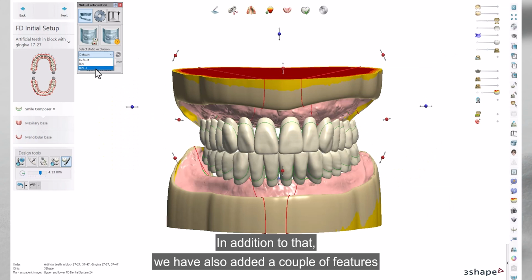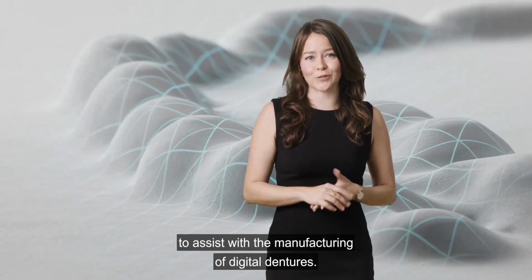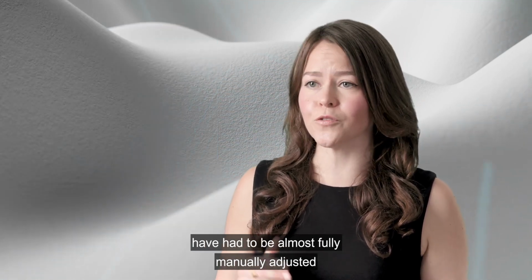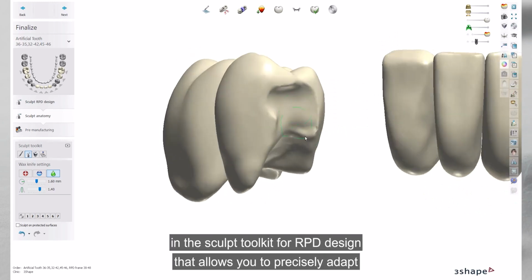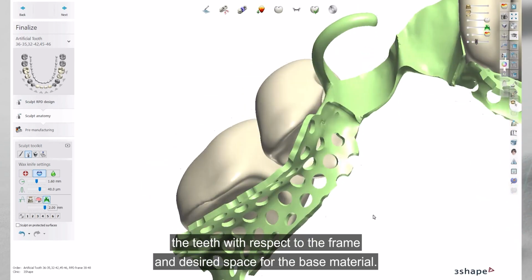In addition to that, we have also added a couple of features to assist with the manufacturing of digital dentures. So far, digitally designed artificial teeth in the RPD module have had to be almost fully manually adjusted after production to fit on the denture frame. In Dental System 24, we have implemented an extra tool in the Sculpt Toolkit for RPD design that allows you to precisely adapt the teeth with respect to the frame and desired space for the base material.